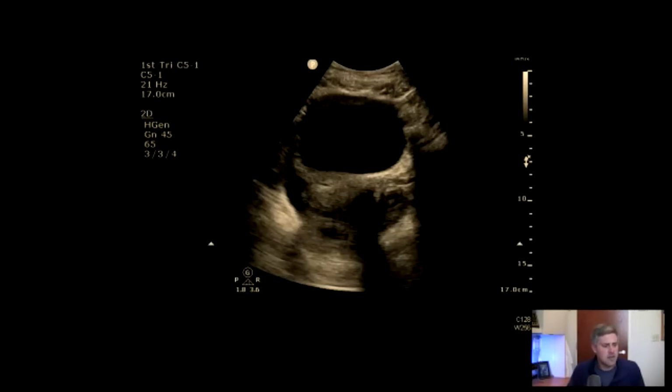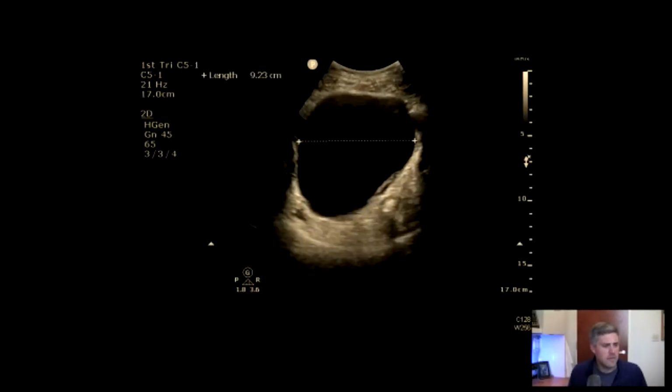So this is the image that was obtained for a transverse bladder, right? So it's kind of got that anechoic fluid collection appearance. That's contained fluid, it's not free fluid. So we got that. And then we have the sagittal oriented bladder, right? And they measured it, and it's rather large. It's 9 centimeters in length. So this patient, for all intents and purposes, presumably has urinary retention, right?